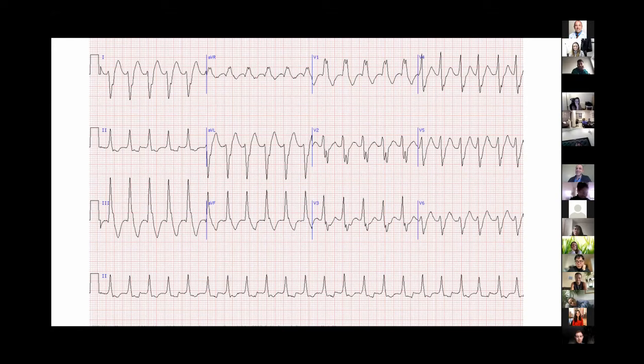Yeah, go. So again, we'll go through the criteria, but I can't help but notice the V1, the R prime with the left ear higher than the right ear. Yeah, so a large R, R prime, right? So that's one of the things.